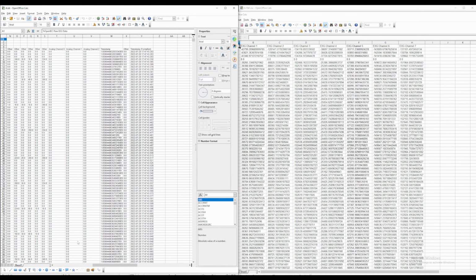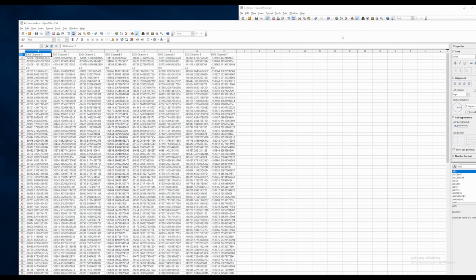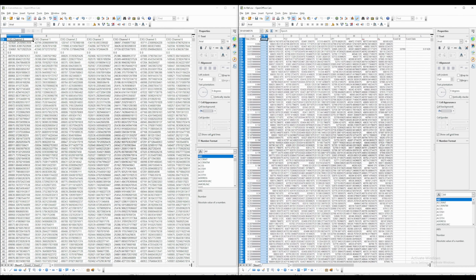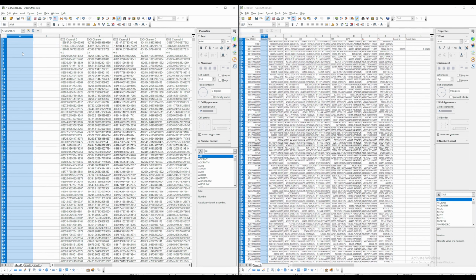We can use these timestamp and index columns, but let's just do it from scratch, and then I'll show you some tricks. So first of all, we need these 2 extra columns, 1, 2, for our time column and epoch column. And we can go ahead and copy the header, but let's say we don't have a reference header. So it's capital T, I, M, E, colon, your sampling rate, which is 250, and capital H and small z for Hertz.